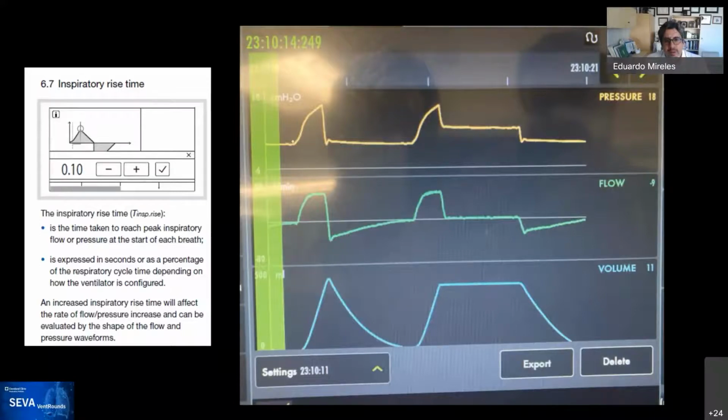So as you know, we can do an end inspiratory pause, and Haura put that on the chat. She says, well, you need to do an inspiratory pause. So here is the same waveform, and now the time is a little bit prolonged. So this is 1 second. You can see we expanded and it's easier to see the waveform, and now it doesn't look like a square. You can see that here, and so this doesn't rise immediately as it should, and this should be a straight line all the way over here.